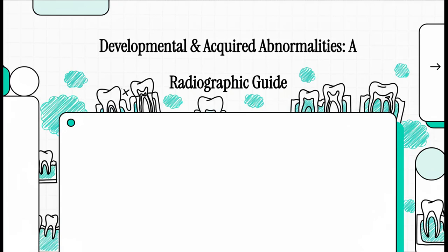Welcome. In this explainer, we are going to get really good at reading the stories our teeth tell us, specifically through radiographs. We're going to focus on mastering how to diagnose both the problems that teeth develop over time and the ones they're born with. So let's jump right in.